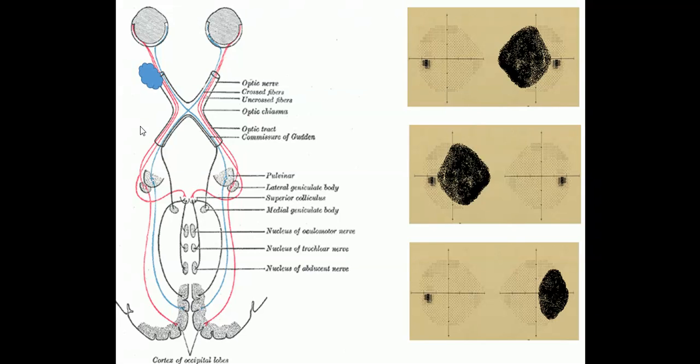So we know again that because we're looking at this as if it was an MRI, this is the right side, this is the right eye, and therefore in terms of our visual fields, we said that these are the left eyes. So certainly this answer would not be appropriate because that's not where the mass is compressing. So that means it's either going to be this visual field or this visual field, the top or the bottom one. That's the correct answer.